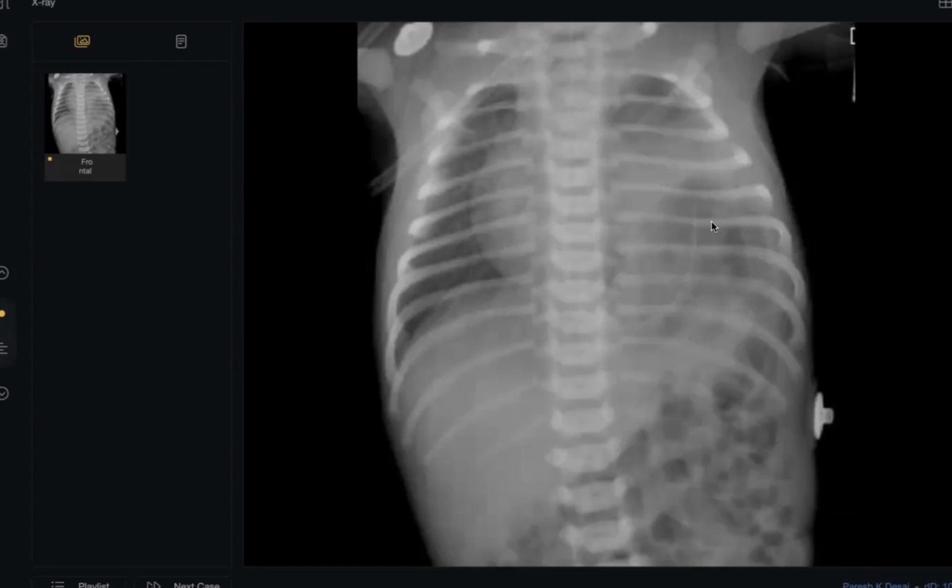Yes, I can. Okay, I'll use the stethoscope to listen for bowel sounds in the left hemithorax. By the way, my colleague, I think this tube was bought as a diagnostic. I think the first film was without the tube, and they bought this tube to be sure this is a diaphragmatic hernia.